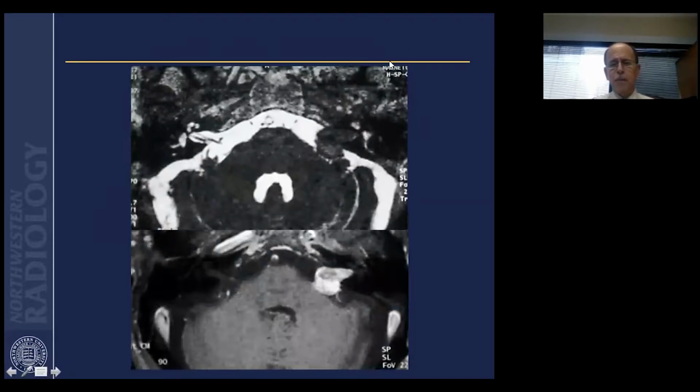This is a typical vestibular schwannoma on MR, which is pretty much filling the internal canal. It's kind of dark on T2. It's abutting but not displacing the brachium pontis. And you may see uniform enhancement on contrast scans, or there may be some heterogeneity.